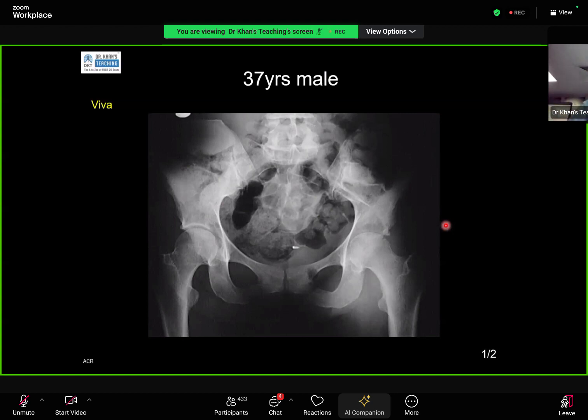There is also distension of the fatty planes, particularly the iliopsoas and the capsular. Also, I think the obturator is also distended. So my first differential diagnosis would be septic arthritis. I would do ultrasound to confirm my findings. In an adult, you can do ultrasound, but better is what?